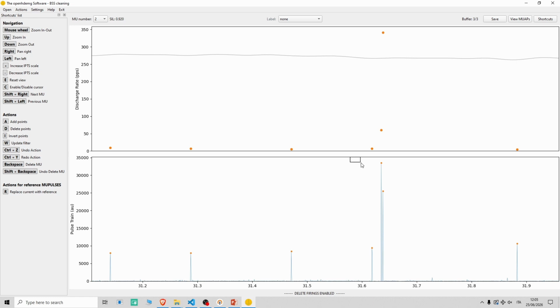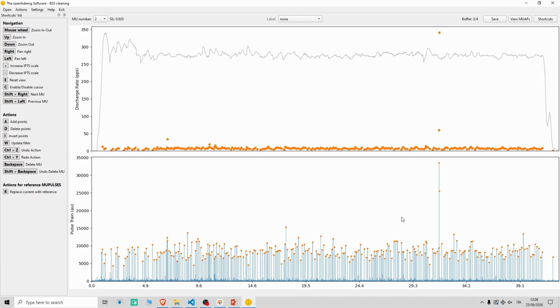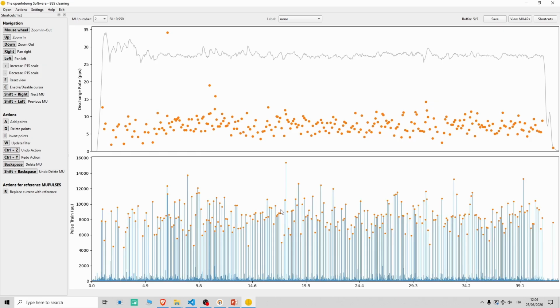But let's say we want to delete these firings here, just because we don't know which one can be problematic. And you can see that automatically the user interface will update and show how the motor unit will look if we don't have these additional firings. And if we click, for example, where is it? W. As we can see here, we can update the separation vector, and therefore we can re-estimate the source.